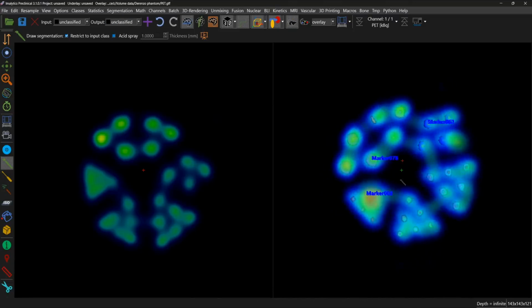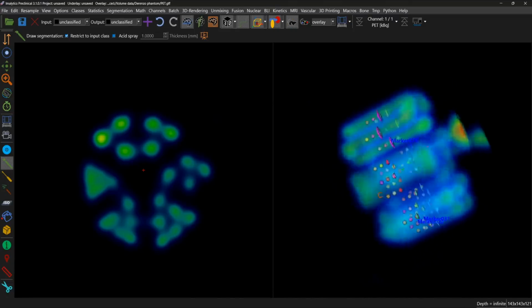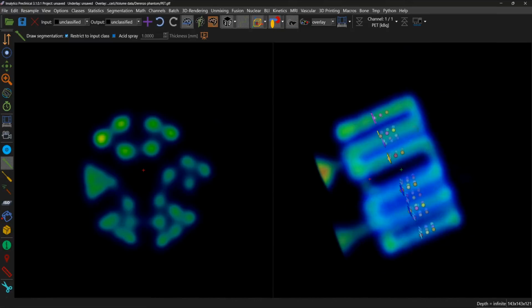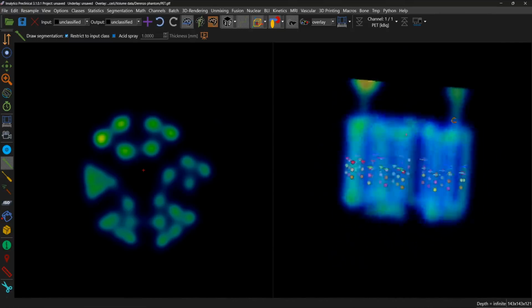And in the overlay we have these markers that get placed. These markers are placed 3 per rod, so it is technically one linearly filled channel, but certain regions of it are constricted to certain diameters.